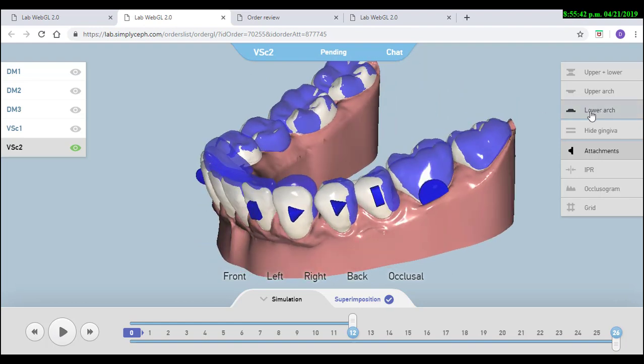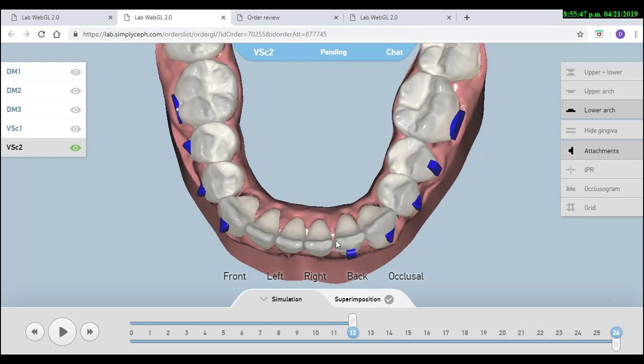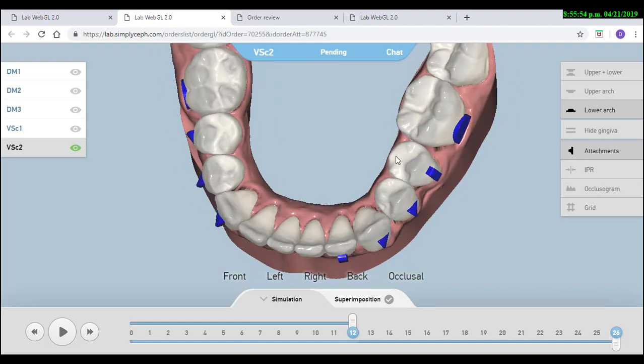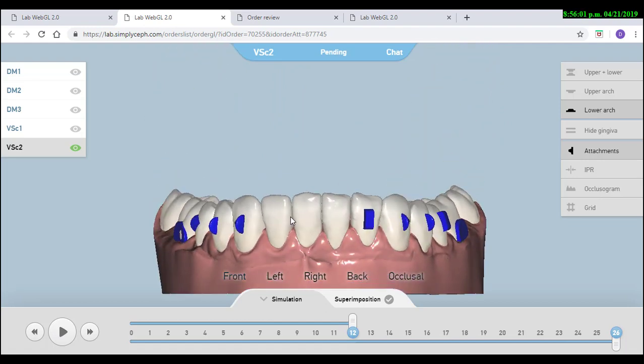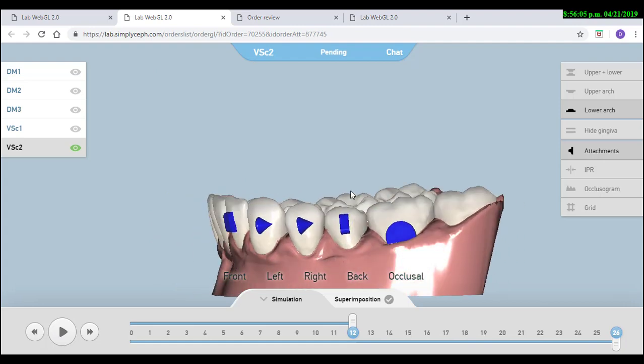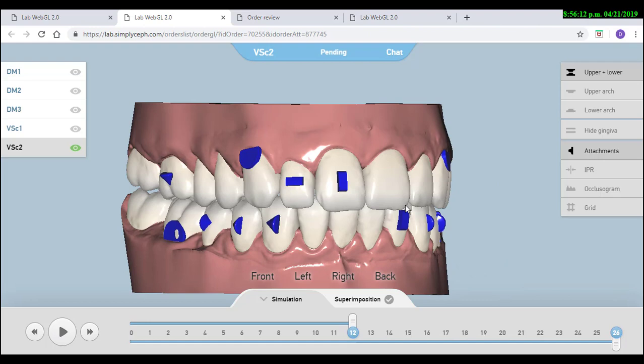For example, if we have a big rotation, let's say in this lateral, we may need to create dimples with detailing pliers, or if it was a premolar, we may need to use some buttons and elastics to help finish that rotation. This is also something we may need when we have a patient with high density bone, where we may add an auxiliary technique. But normally if we stay near those values, the final result will be really nice.